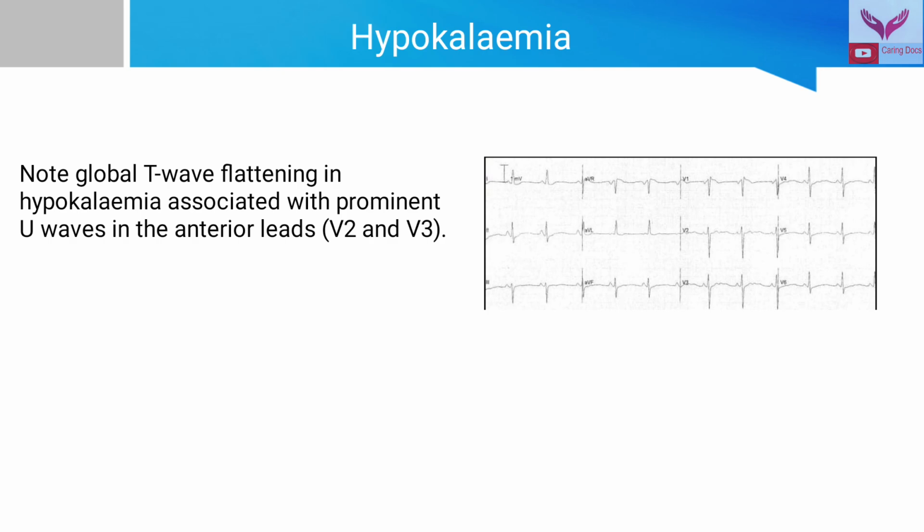In hypokalemia, we see global T wave flattening associated with prominent U waves in the anterior leads, that is V2 to V3.